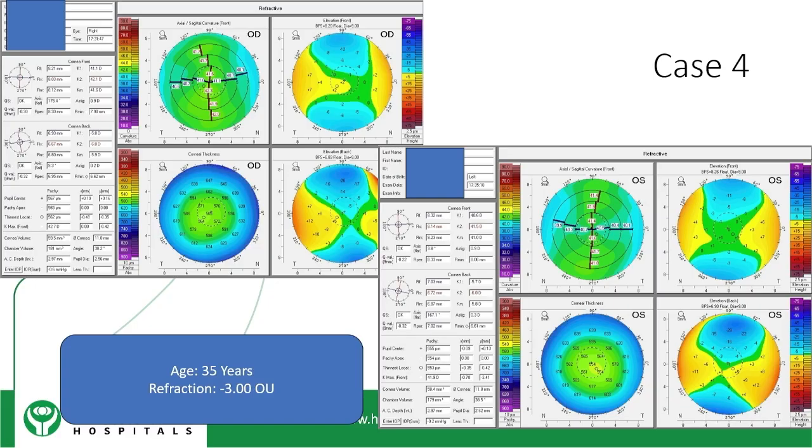If you've got a very advanced keratoconus, you're going to have a quality specification value that usually is in the abnormal range, because imaging an advanced keratoconus case is very, very difficult. So it's not always the quality specification value you're seeing. And sometimes when you have corneal opacities, the quality specification value will come back normal.